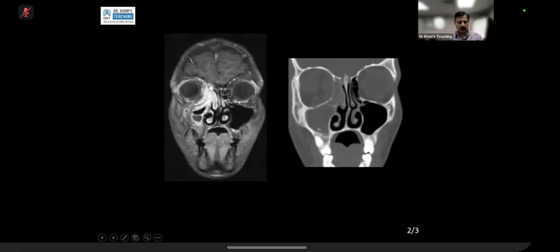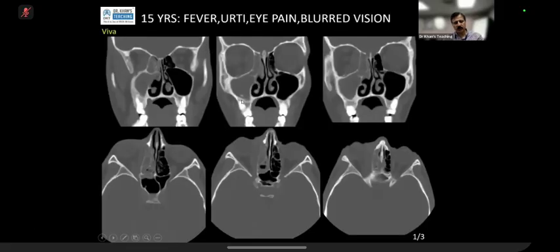Give me your diagnosis. Nasopharyngeal angiofibroma. So your anatomy is nasopharyngeal angiofibroma. We are at the level of the ethmoid sinus. So let me take over. Now, this is a classical exam case. This clinical was quite leading that something bad is happening.